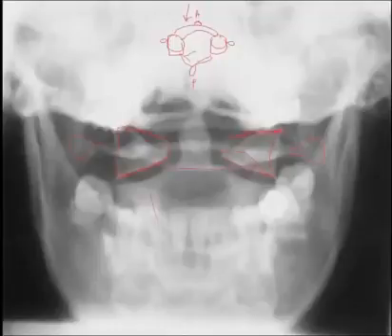Now this is not the optimal projection to see the anterior and posterior arch, however you do see the shadow of them. One of the dilemmas of AP open mouth projections is that the superimposition of the anterior or posterior arch on the dens can create this lucency, which we call a Mach band effect, and can simulate a fracture of the odontoid process. The tongue can do a similar phenomenon, so just be careful when you're looking at the densities in this region.